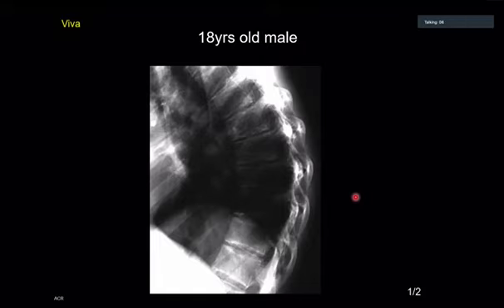This is a lateral radiograph of the dorsal spine. There is preserved alignment of the dorsal vertebrae. One of the middle dorsal vertebrae shows decreased vertical height. There is also diffusely decreased bone density of all vertebrae. On top of my differentials would be an osteoporotic compression fracture.